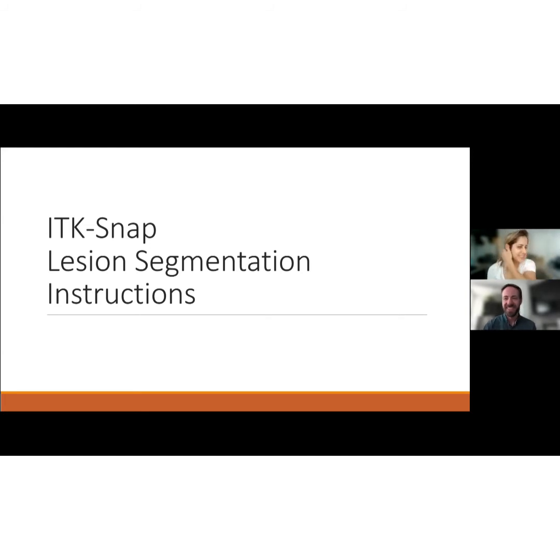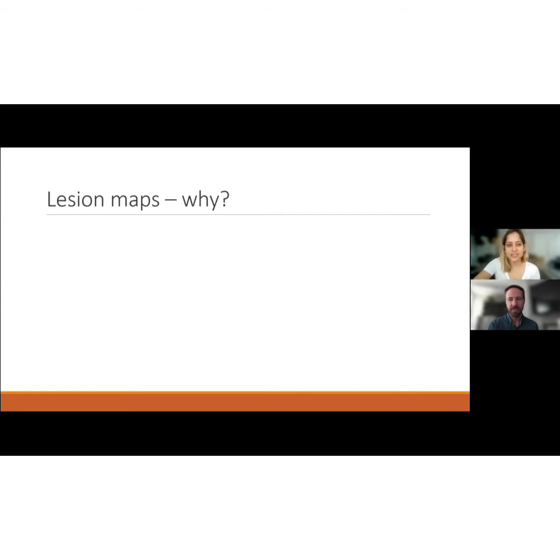Fine. So in this video, we are going to go over the ITK-snap tool we use for lesion segmentation and creating lesion maps within our patients that have undergone strokes, right? They have lesions and we want to segment the lesion, and we're going to demonstrate how we're doing this. So first, just a brief explanation for why we need these lesion maps.